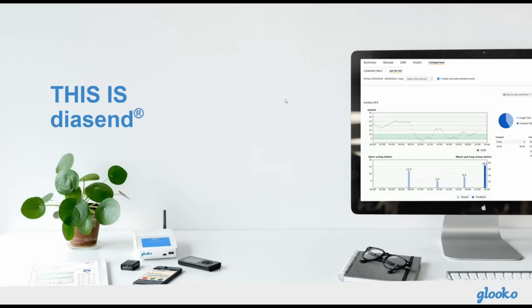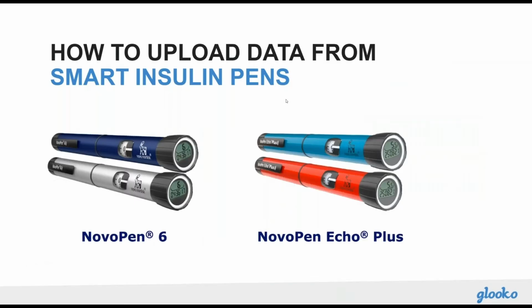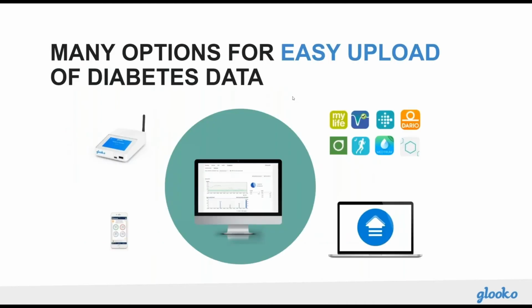So first of all, we have the smart insulin pens themselves. You can see those displayed on screen here, and we're going to cover how these can be used with the diasend platform to really get the most out of those pens and the data that they provide.